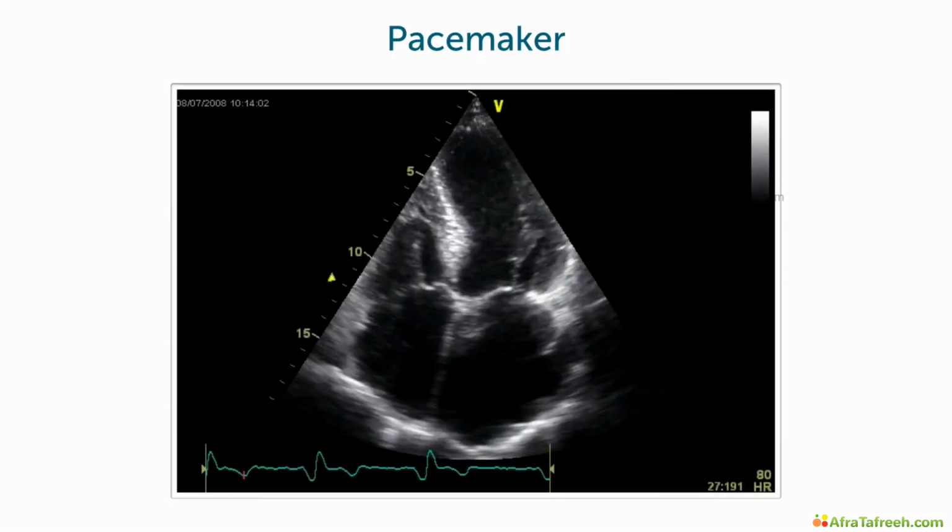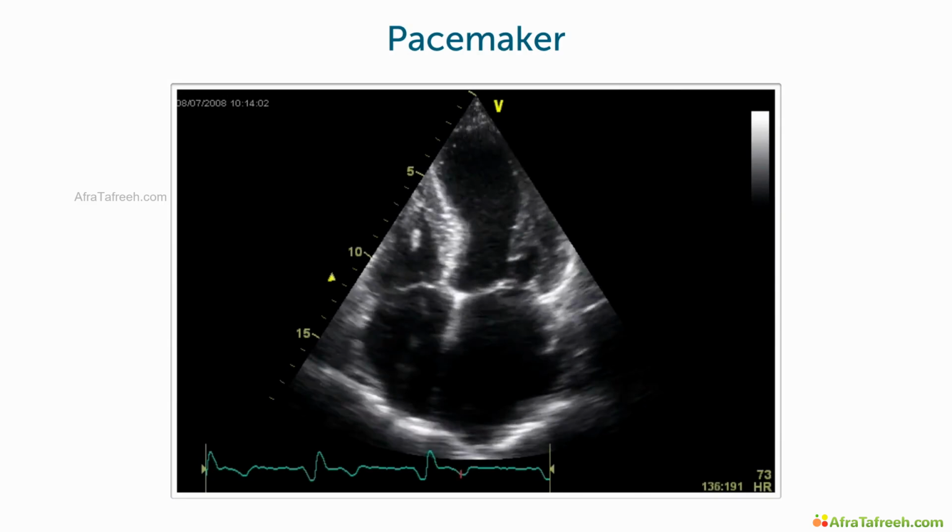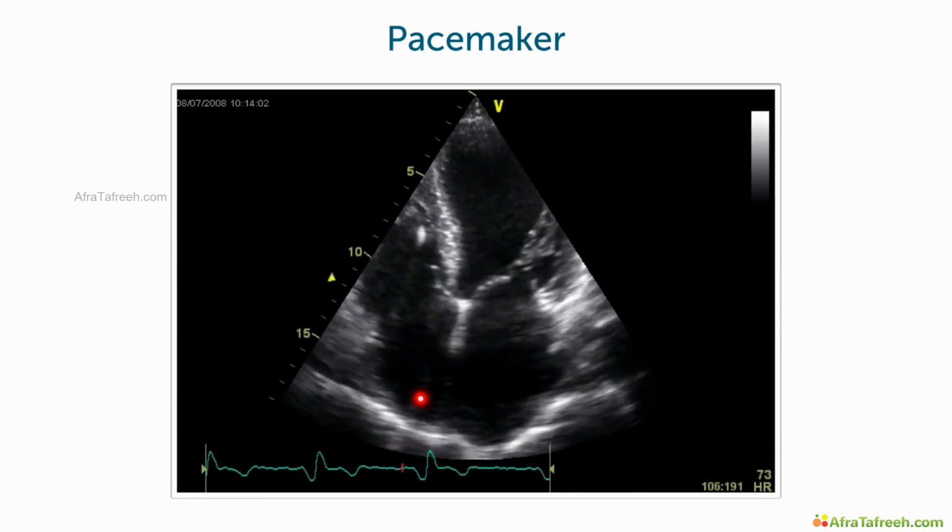But for us in this chapter, it's just important that you do not mix them up with a tumor. But beware, sometimes you can have structures on the pacemaker leads as well. Here's another example of a pacemaker lead, where you nicely see the artifacts which are produced by this pacemaker down here.